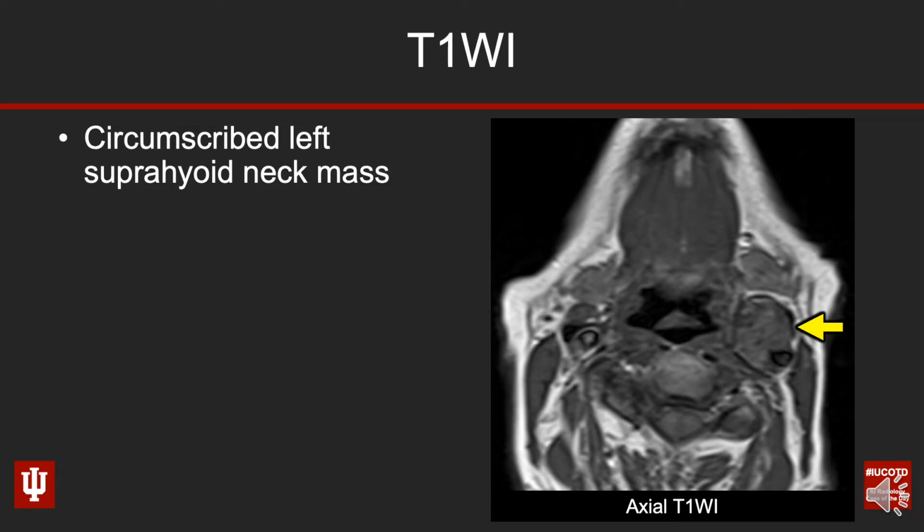So let's start by looking at the images. First up is the axial T1 weighted image. Again, this is a non-fat saturated pre-contrast T1. There are a lot of places that like to fat saturate the pre-contrast T1 weighted imaging. I think that's in general quite a mistake. We like to do ours here without fat saturation because you want to see that fat. Where you see the fat on head and neck cases is really critical for being able to figure out where tumors are involving, get a better sense of the anatomy. So use the fat to your advantage. Okay, enough of that soapbox.